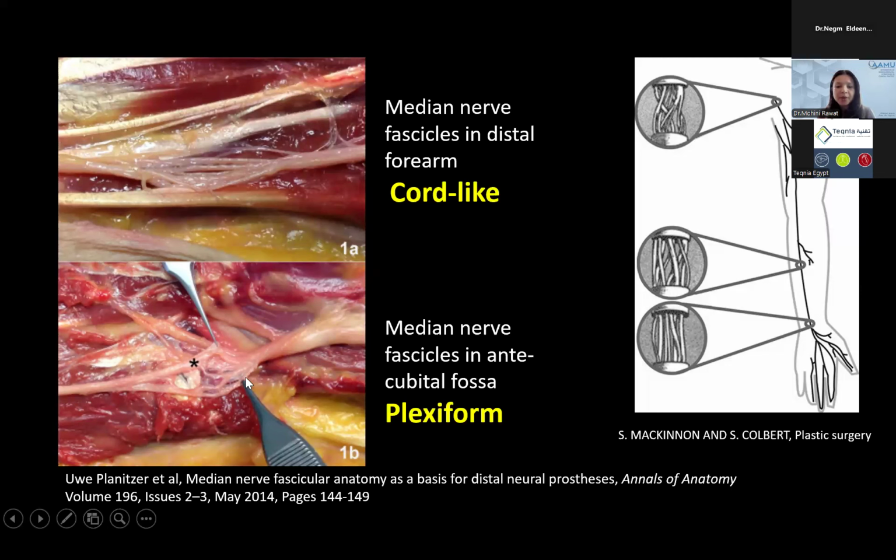So why I'm mentioning this is because for certain sites, we already know that the fibers, or fascicles within the nerve, are going to crisscross versus stay more parallel. This is important because you may see more internally darker signal versus nicely defined honeycomb texture based on which region you're looking at. So some examples of this are coming in the next couple of slides.